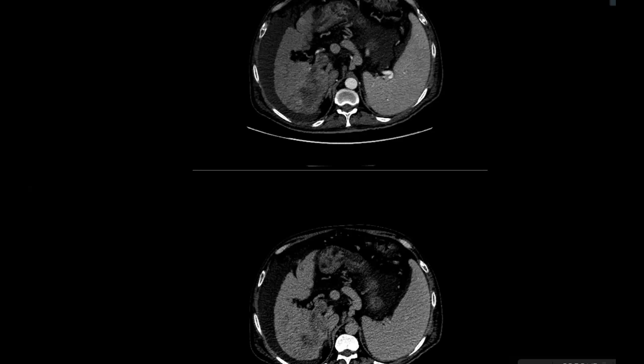I have no idea about LIRADS. I can't apply them. Anyone has an idea about LIRADS? LIRADS is a reporting system like BIRADS. I know that's important, but I can't recall them. These are the liver imaging... Yeah, this is TIV, tumor in vein. So HCC within the vein. So this is completely different.